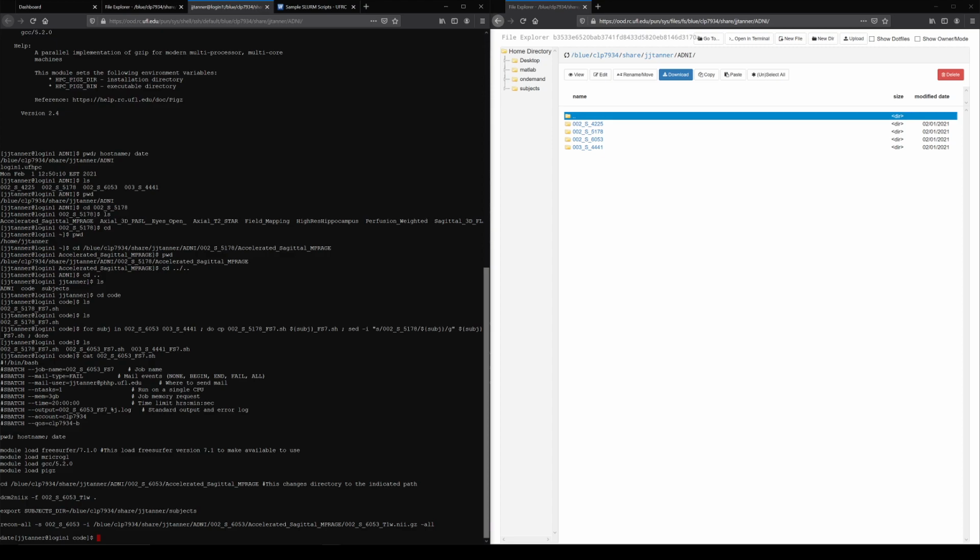Again, not a big issue if you're just doing a few of these, but if you have to do hundreds, this saves you loads of time. That was a command I knew would work because I do that almost weekly. And so that is something that can save some time.